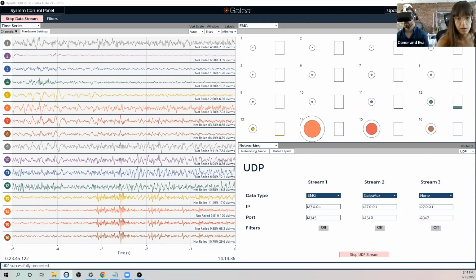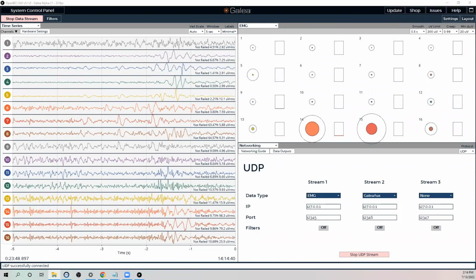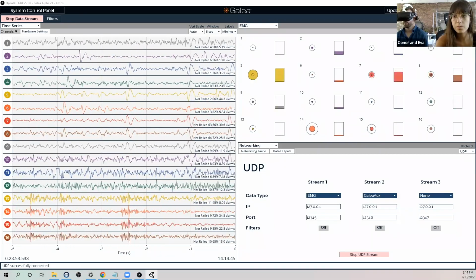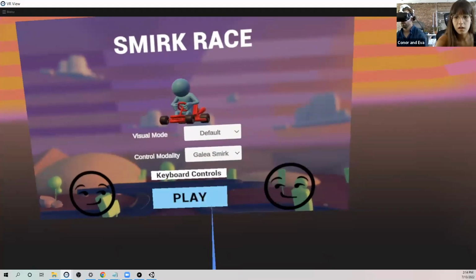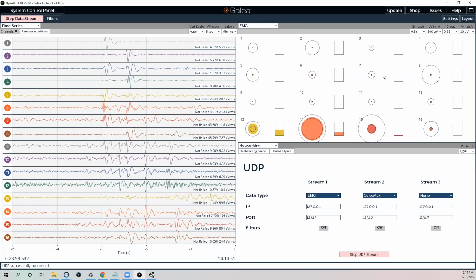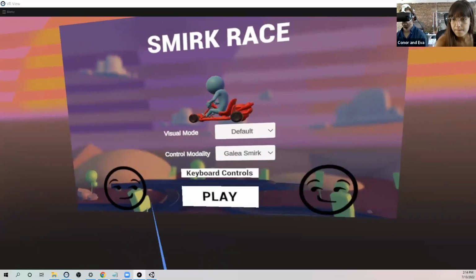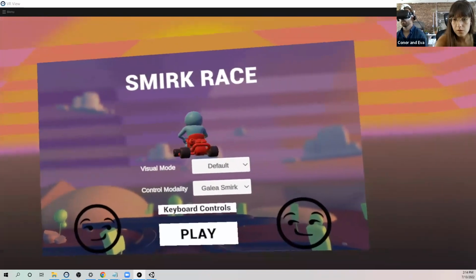Let me try again. Okay. Eva, maybe you can mute while you're troubleshooting. I think it should be on. It didn't crash us then. Cool. So what's this one? The widget. Let's make sure that we're streaming data. Yeah, I have the stream on.